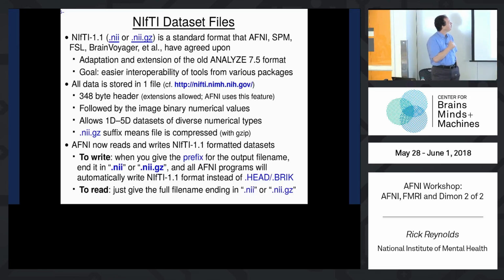How do you create NIFTI data sets in AFNI? Basically any AFNI program can do it. If you're using 3dcalc, or any program in AFNI that creates a data set, you can say to make it NIFTI. How? If you do 3dcalc, which is a three-dimensional calculator, if you want to add two data sets or divide by 3, whatever, and your input data set is EPI, and you do -prefix new, it's going to make new+orig.HEAD and .BRIK, right?